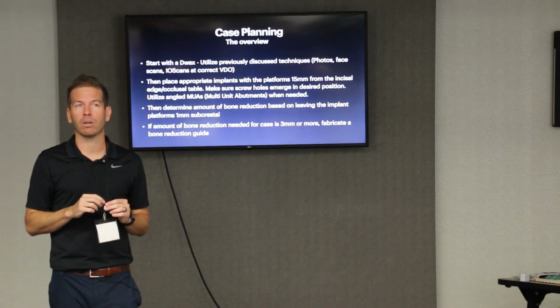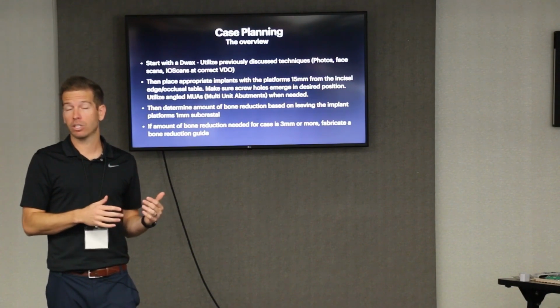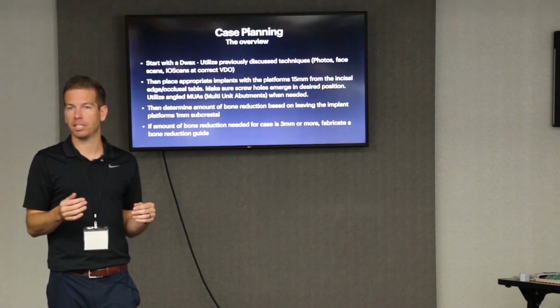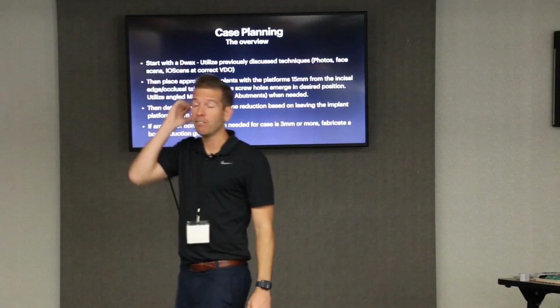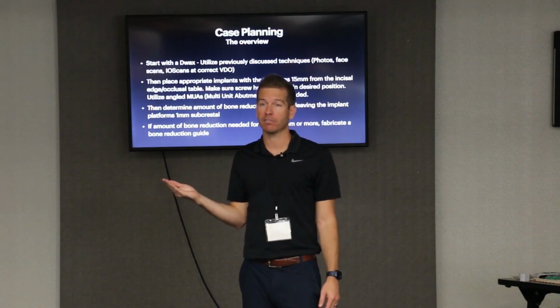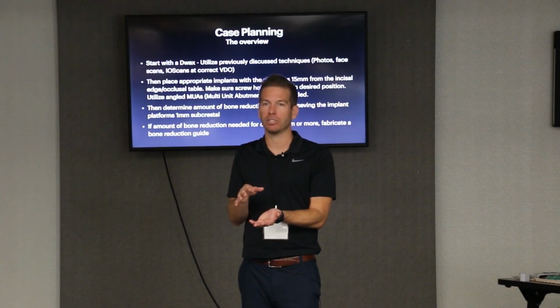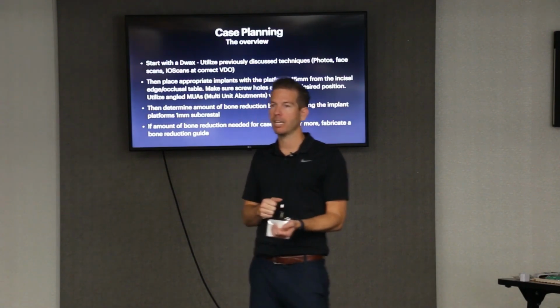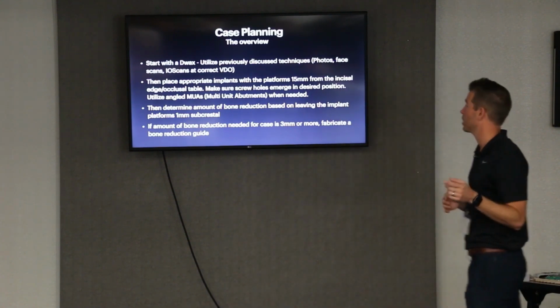You're thinking about your future vertical when you're taking records, so that when you do your wax up, it's accounting for that future vertical. That's a really good point, because if you just scan them in their current bite and they needed to be opened up because of collapse, you'd have to arbitrarily guess on that. So your digital wax up has to take that future vertical into consideration. And I'll show a good picture of that in just a sec.